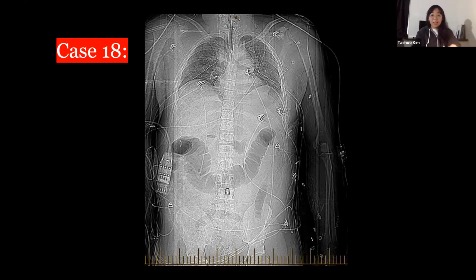Yeah, that's the comment I get. So that's why we scan patients, but we often do repeat follow-up CT pancreas protocol a few days later to check if there's any complications. Thank you, Dr. Bake. So here, to come back to this case, I wanted to show you this.